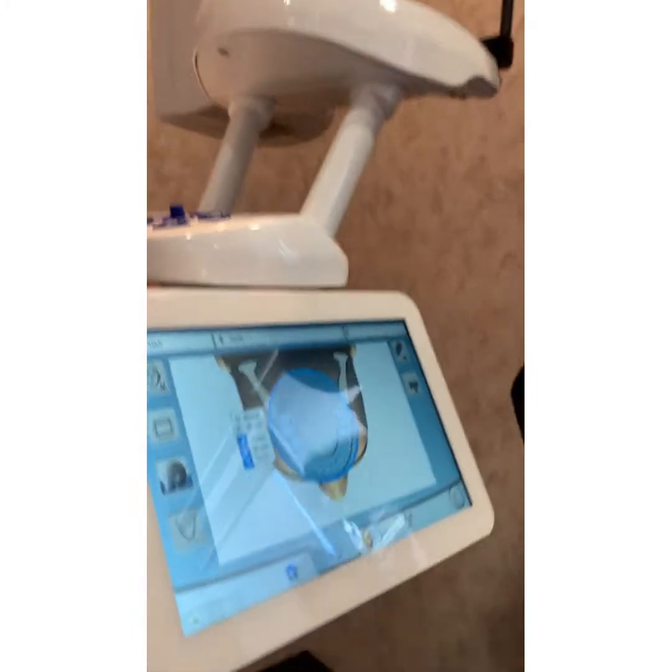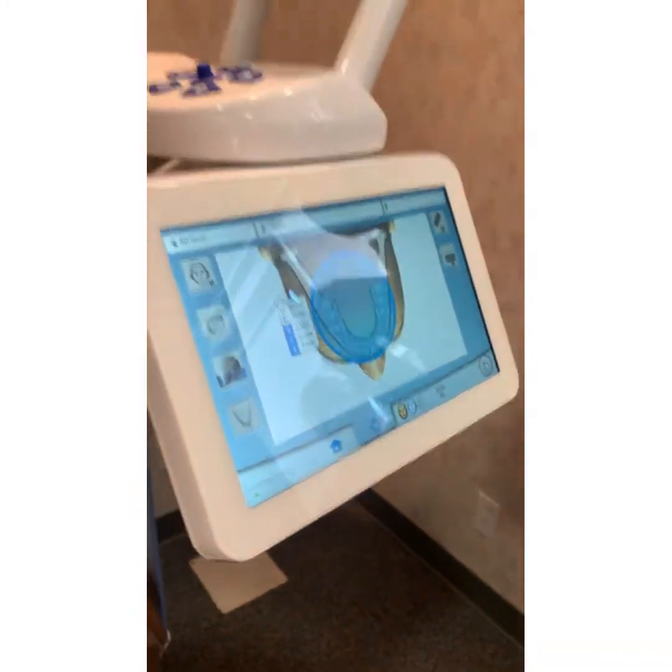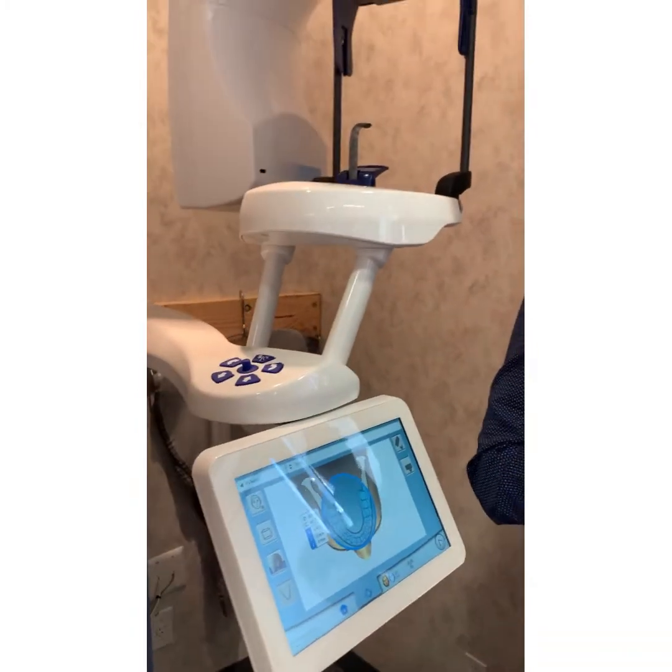Why did that tooth fail? I want to get more anatomy around that area. So they're taking 2 arches when they're just trying to see number 14.